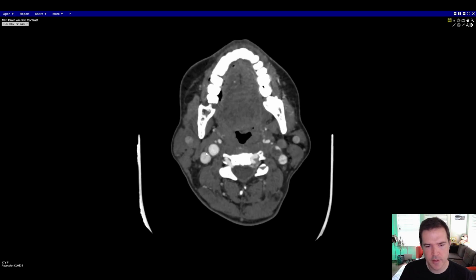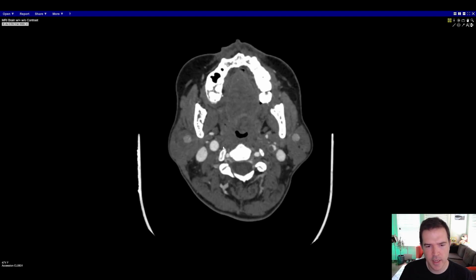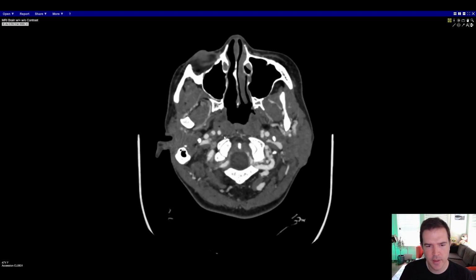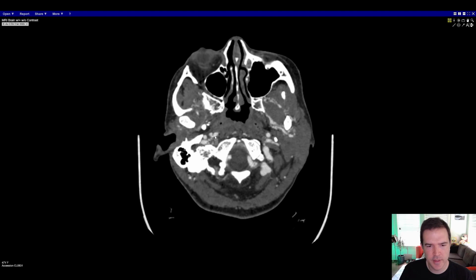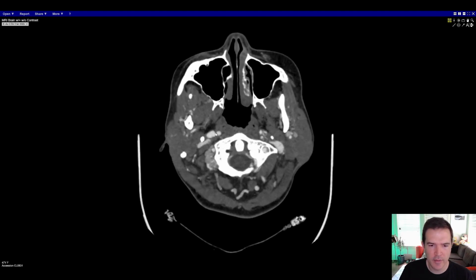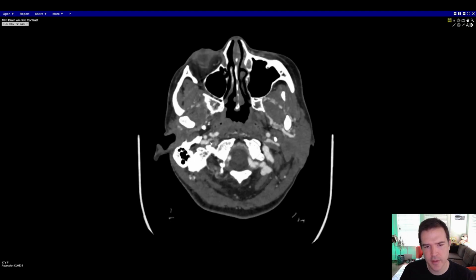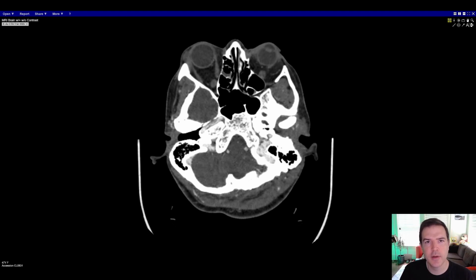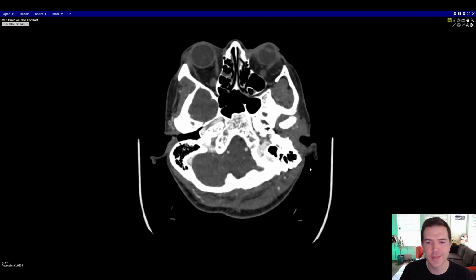As we get into the distal carotid artery in the neck, it's looking okay. The caliber changes a little bit here. It gets very tortuous, and you have a little bit of narrowing there. It gets a little wider again, very irregular looking. So that is definitely not normal, but it doesn't exactly explain the abnormality that we were seeing on the MRI, because it's on the wrong side.